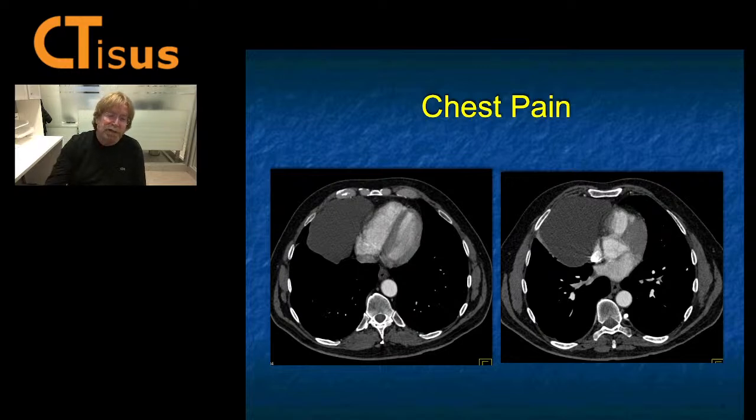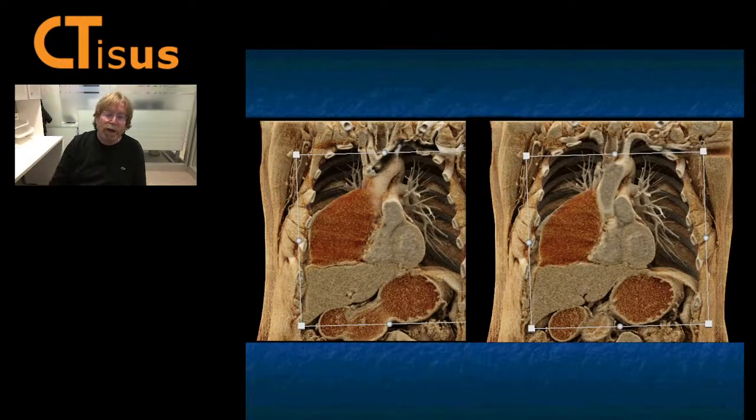But then if I show you this case, whoa, it's going way up to the mediastinum, and I'm not showing you all of the images. So what could this be? Bronchogenic cyst, wrong location. Duplication cyst, pericardial cyst is still good, but what if something was coming down from the mediastinum? It's not going to be a teratoma. Those can be cystic, but then they're solid and there's vascularity, fat, and calcification.